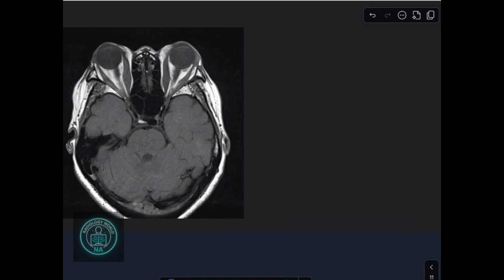Let's move towards our next spotter image. This is very classical. Again, it is important not only in your radiology residency, but even I would say very important for MBBS students who are watching this video, and also from the NEET PG point of view. You can see here a very fusiform enlargement of the rectus muscles. In this case there is a fusiform enlargement of the medial rectus muscles on either side. The lateral rectus is also somewhat bulky, but in all the muscles there is a characteristic sparing of the tendons. So this is basically a case of thyroid associated orbitopathy.